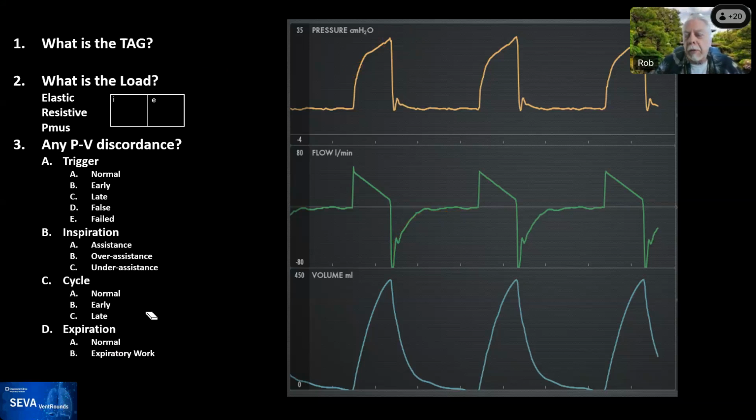Do we see anything that looks a little suspicious in the flow or pressure waveform? You see these little perturbations here. You see that? They're all over the place. So we'll come back to that in a second.